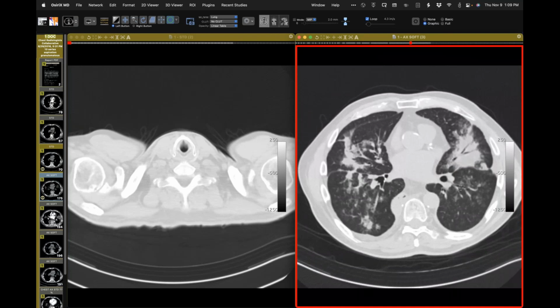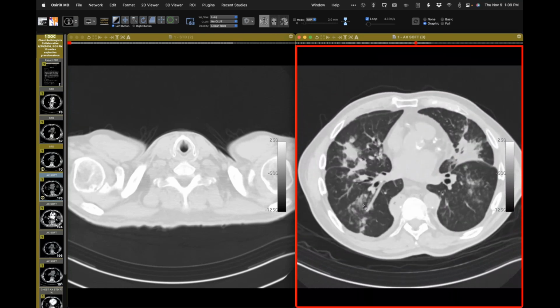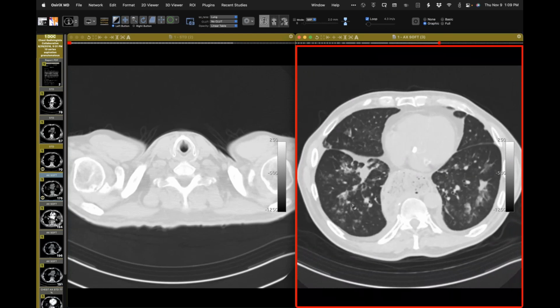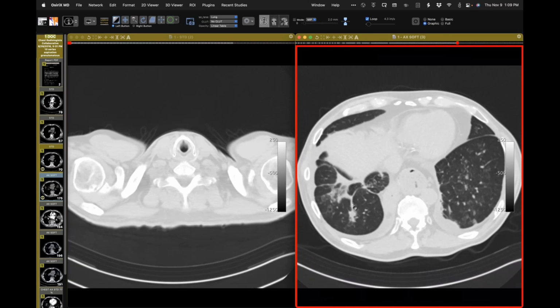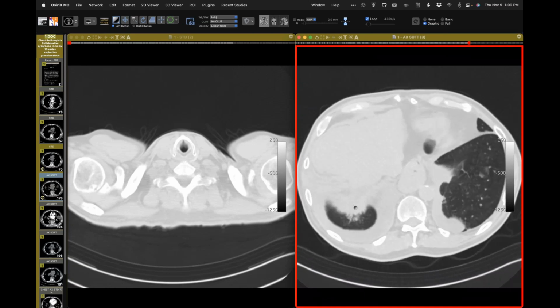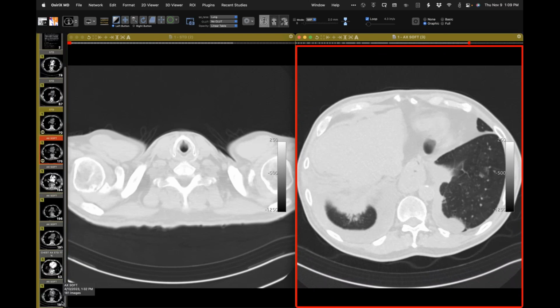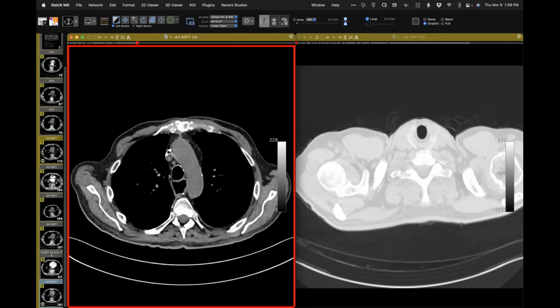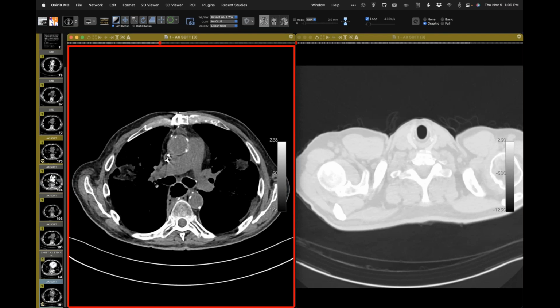What kind of history would you really push for in a patient with this progression over time, persistence over time, these imaging findings, and a patient with a gastric conduit? Good story for aspiration. Right, exactly. Now we know what's going to happen over time because this is such a typical occurrence, with the diagnosis being exogenous lipoid pneumonia.